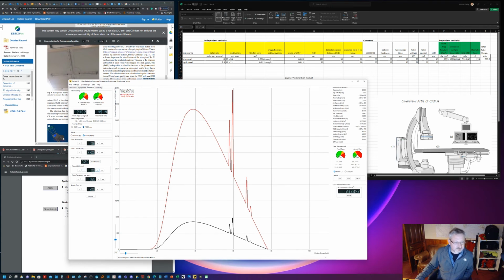So there's 11 milliseconds. Okay, so that's all of those done. Now we've changed that, patient's the same thickness, we're going to run it for 30 seconds, the kV remains the same, the mA remains the same, we're not ignoring that. So we're ready to go, I think.